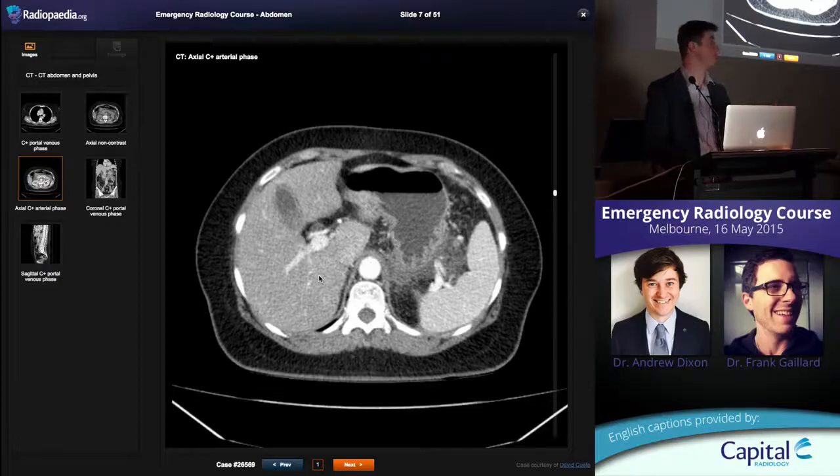Also acute hepatitis, you see that quite often, return traveller, acute hepatitis. The hepatic aspect of the gallbladder wall gets edematous and thickened. You might confuse it for cholecystitis, but it's not, it's just reacting to the inflamed liver next to it.